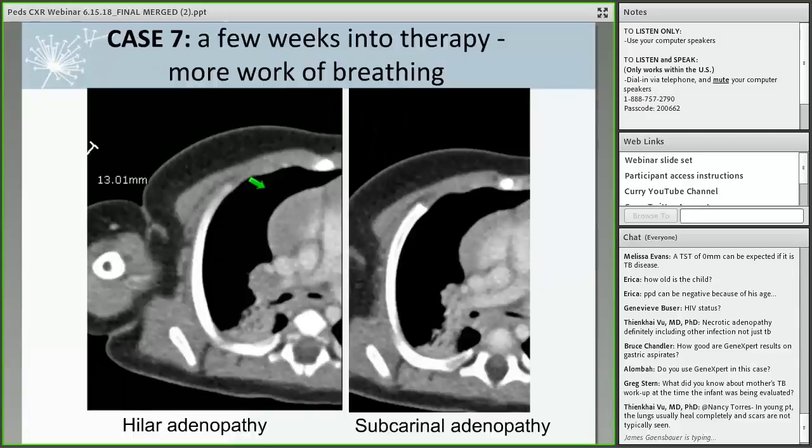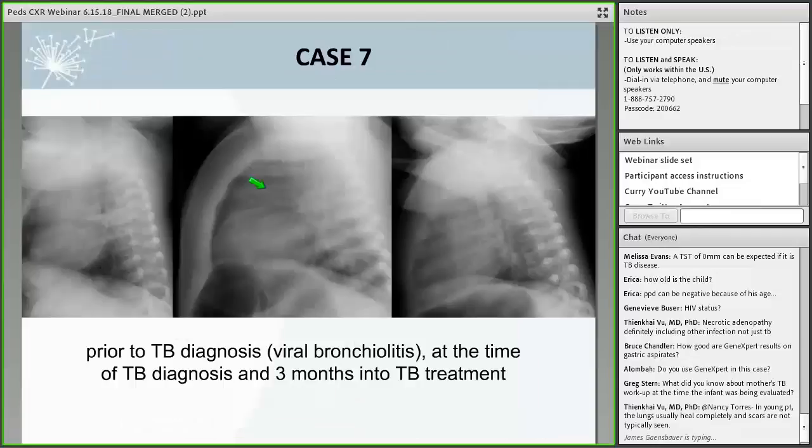And let's see. That's the CT scan. I told you we try to avoid CT scans, and here we're showing you CT scans. And this is over time, his chest radiograph. Let me see if I can pull this arrow over. So this fullness that Dr. Abu was showing you certainly improved. His radiograph improved over the course of the 6 or so months of treatment, and we truly can't know whether he had TB or not.